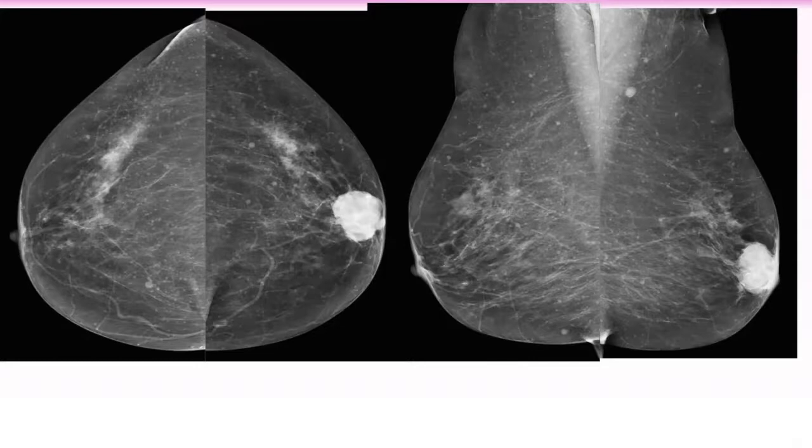So they could be just skin lesions like sebaceous glands? No, not the skin. They are seen subcutaneous and within the parenchyma. It is a rare thing, but you have to think about it.